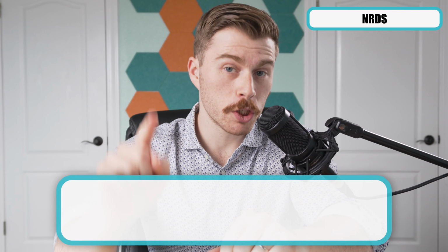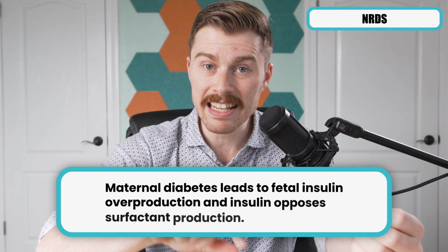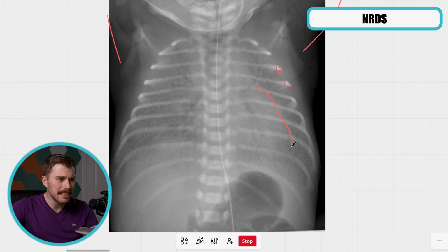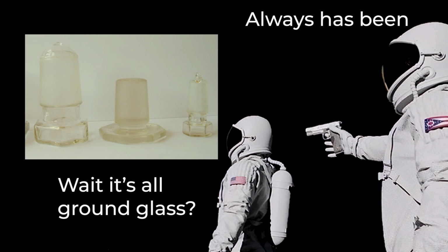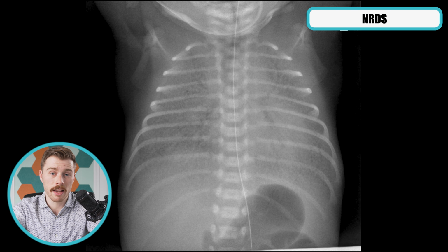Here's a pro tip. Maternal diabetes leads to fetal insulin overproduction, and insulin opposes surfactant production. So, look for preemie babies in moms with diabetes. You can hardly see the cardiac silhouette or anything else, and it's classically described as a whiteout appearance or your ground glass appearance. What a surprise, right? More ground glass. Maybe it was all ground glass after all. Seriously though, this is just ARDS in a neonate, so it looks identical on imaging.